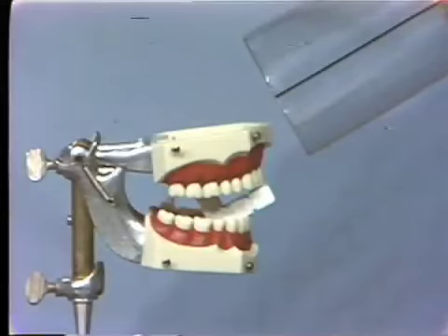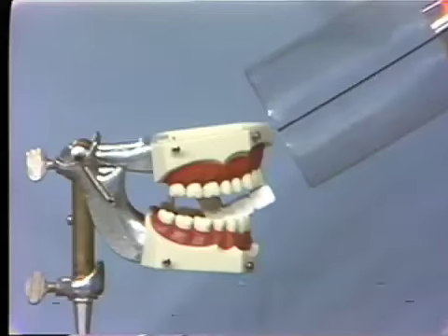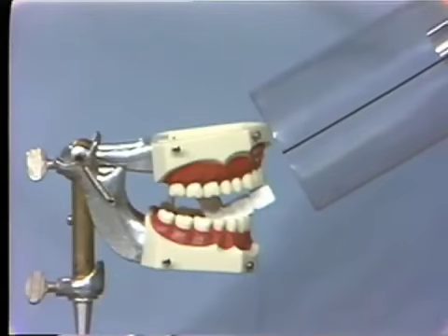The fourth step in making the periapical survey is to direct the beam at the proper spot on the film. Here you see the beam that is aimed too high. The center of the beam is above the film, and the lower half of the film simply isn't exposed at all. Now looking at the typodont, this is the condition that we have right now. Now if I slowly bring the X-ray machine down, now you see what the beam has done.